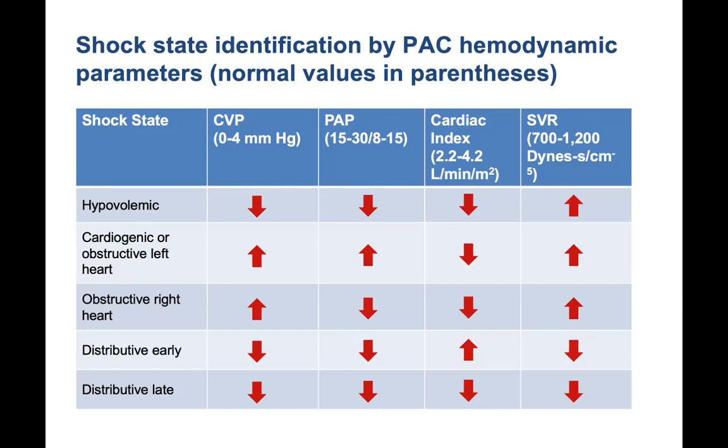In the last lecture, we talked about how we can use ultrasound to determine cardiac output, or what would be here in this cardiac index. And today we're going to talk about how we can use ultrasound to determine CVP and PA pressures. And so now that we can gather a lot of the information that you would get on a PA catheter non-invasively from ultrasound, it just gives us another reason that ultrasound can help us in leading to our differential diagnosis in shock.